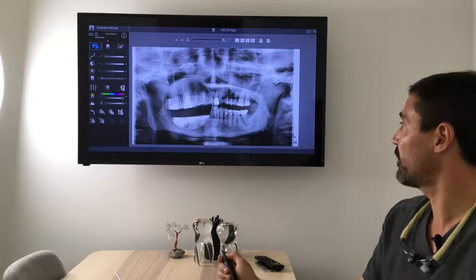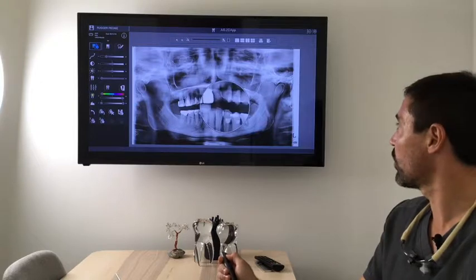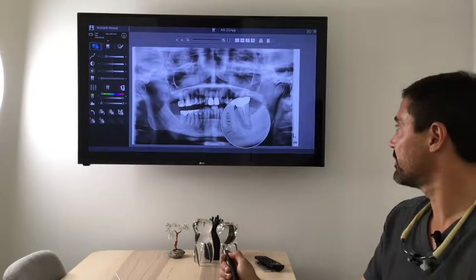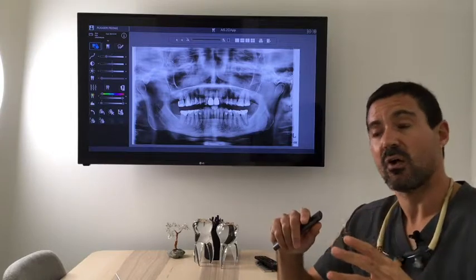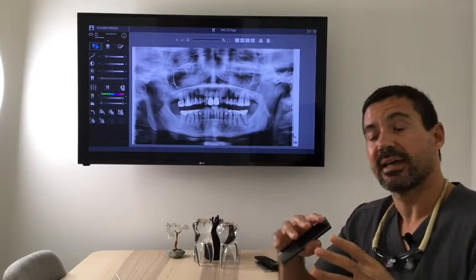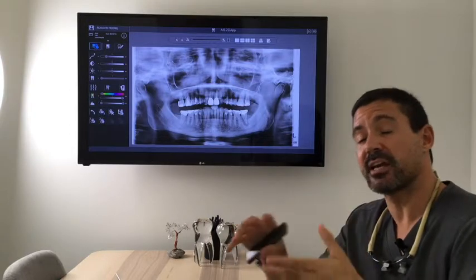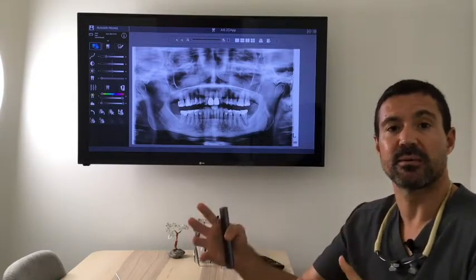Here we took a panoramic x-ray, and she's got other issues in the mouth, but one of the issues that affects the most because it actually hurts was this abscess, this endoperiodontal lesion. And when I consider an endoperiodontal lesion, it's because it involves two problems. One, maybe there is an endo problem that is developing also a periodontal problem. So initially it developed inside the tooth, but then the drainage might drain into the periodontal ligament and end up with that periodontal ligament affected.